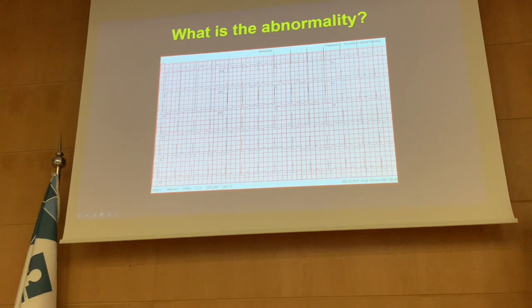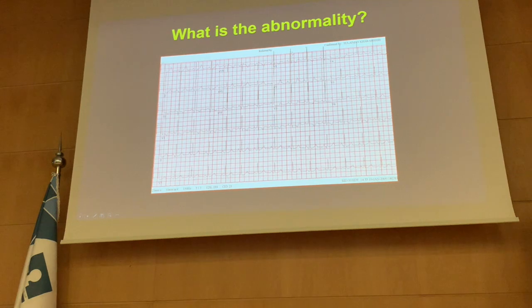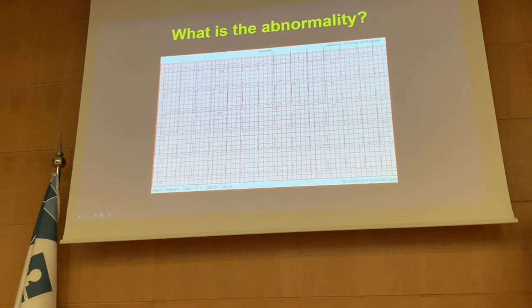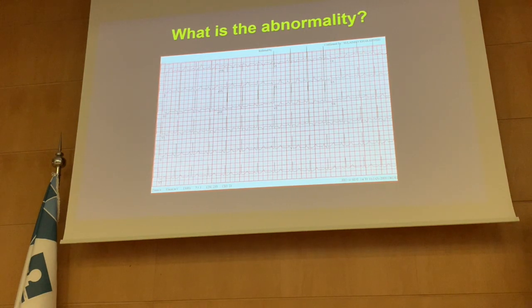That's the easy part. So what do you notice about this ECG? It's tall. There is something wrong with the QRS. The R wave runs into the S wave, so this one is so big for a QRS. So is he normal or abnormal to start with? He has no symptoms, he's okay, but that means there is something wrong in the ECG.